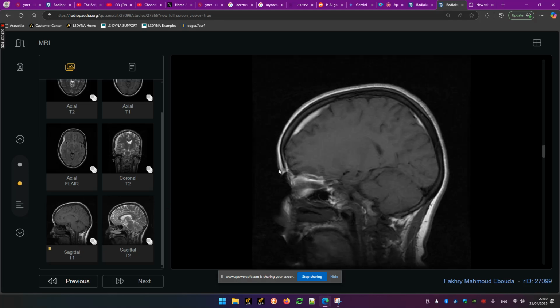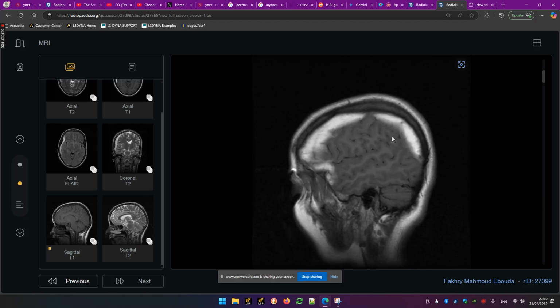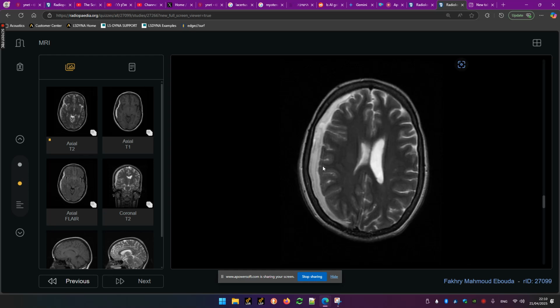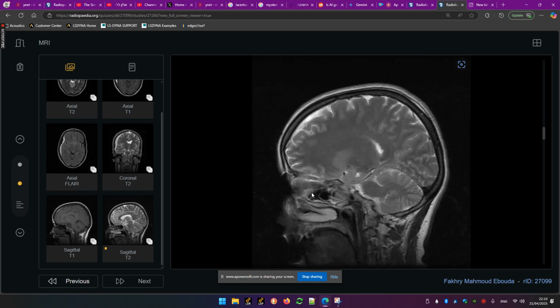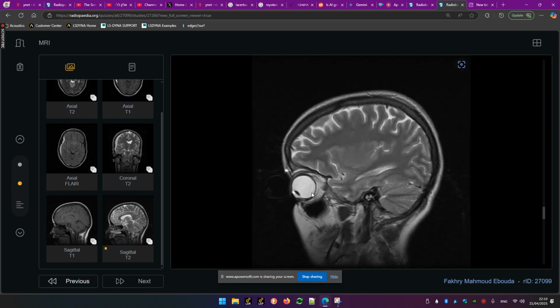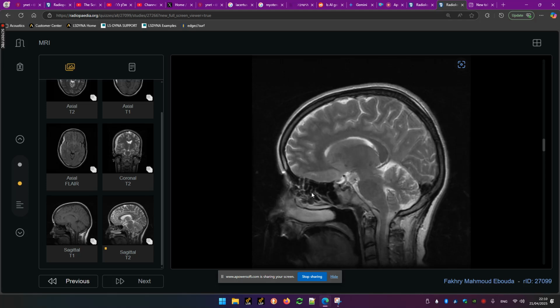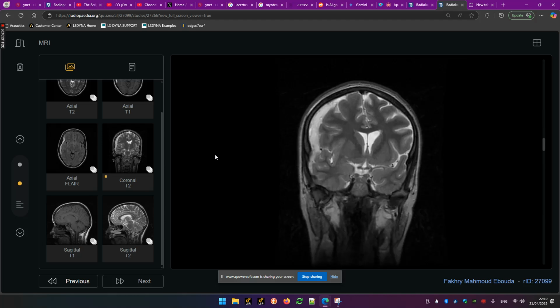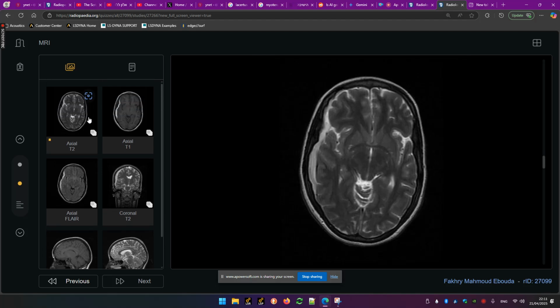Okay, so there is, of course, some hyperintense material right over here, but it's hyperintense in all sequences. And they didn't give contrast, so they didn't even think about a space occupying lesion. What, just subdural with deviation of the midline?